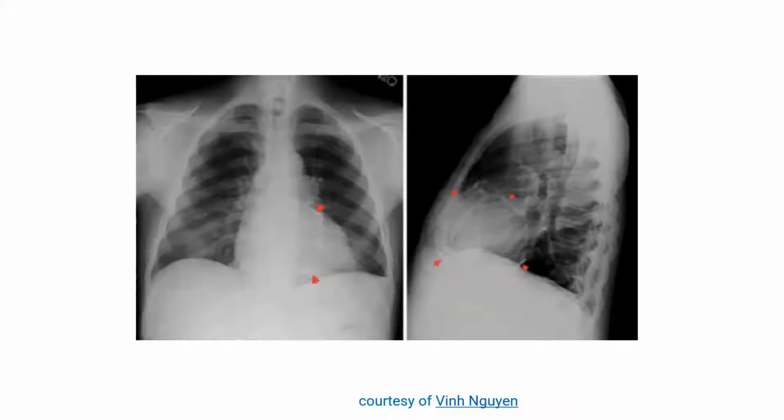Okay, good. This is important. So if you are looking for pericardial calcification in a patient with constrictive pericarditis, I think you need to order lateral, not AP or PA. Okay, lateral. See, the difference is really magnificent.